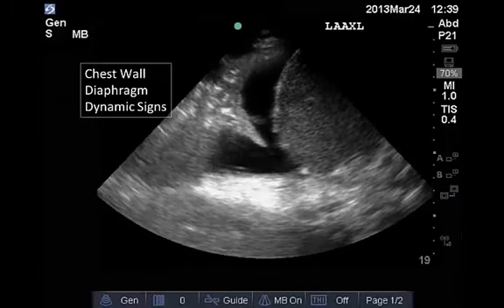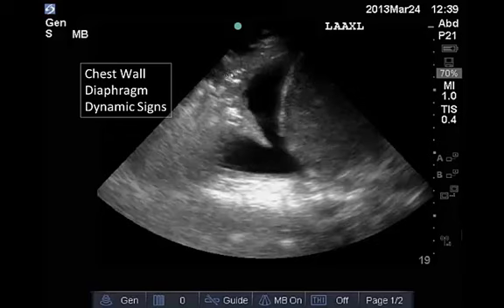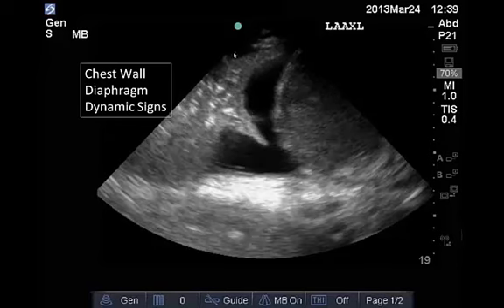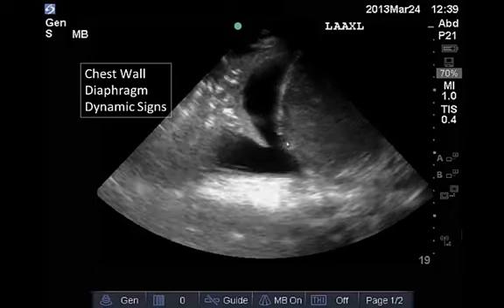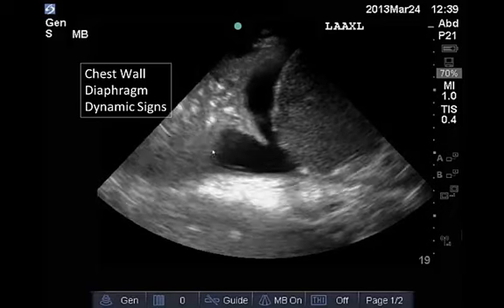So here's another example. Again, nice picture here of spleen, diaphragm, and collapsed atelectatic lung, appropriately though, because you can see how it's encased in fluid. And to diagnose pleural effusion, you really need to see the chest wall. You need to know that you have a diaphragm. Really, you must identify the diaphragm. Not everything that's black and near the chest is an effusion.